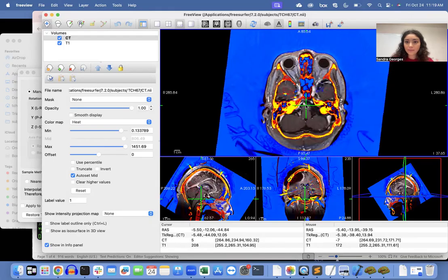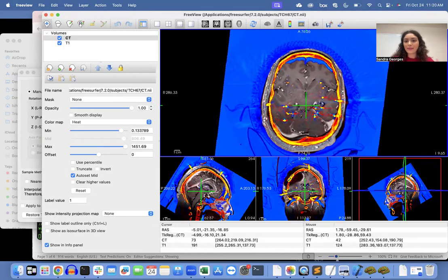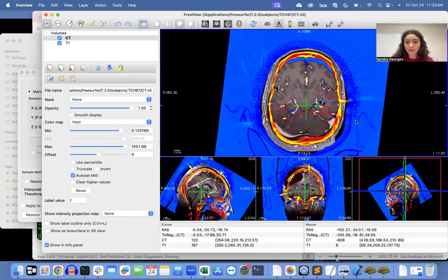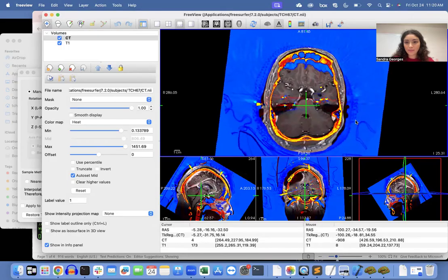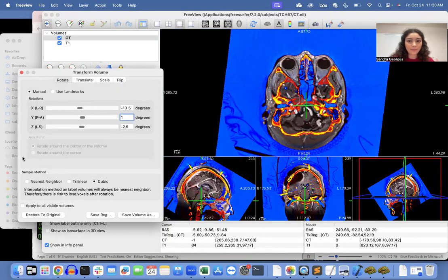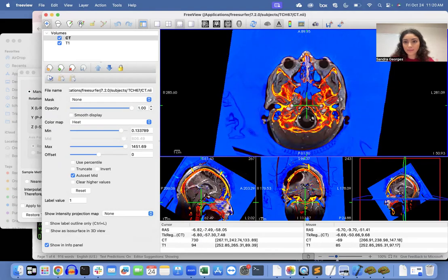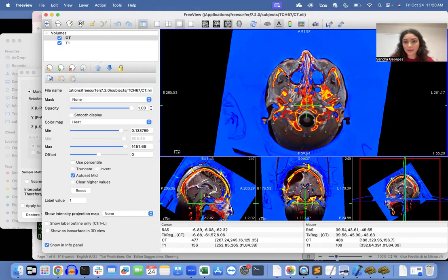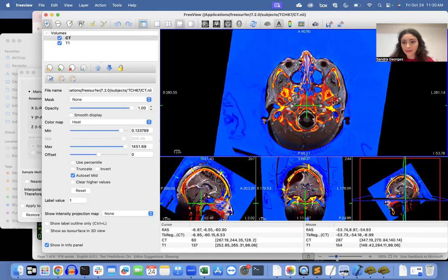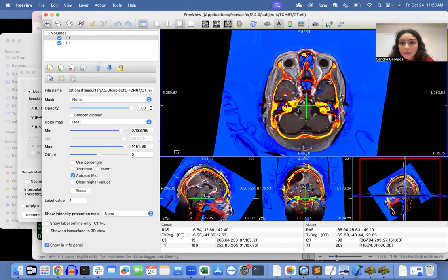So now it looks like they come in at the same time. It's encapsulating the eyes. Everything else is within boundary. I would maybe shift it a little bit more. Let's see. Yeah, about there. See how these fit into the sockets that we were looking at earlier now, and everything else looks like it's encapsulated a little bit better.